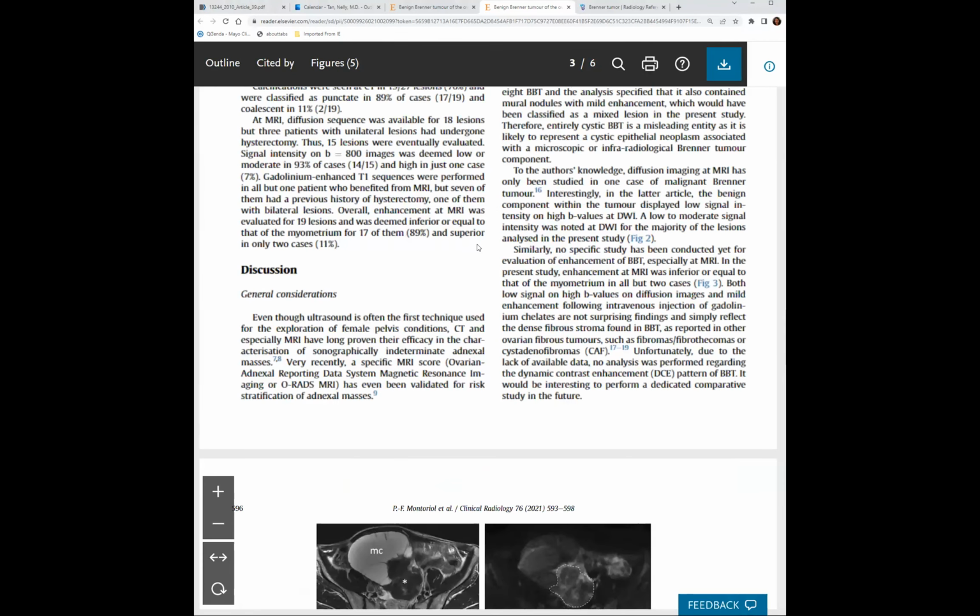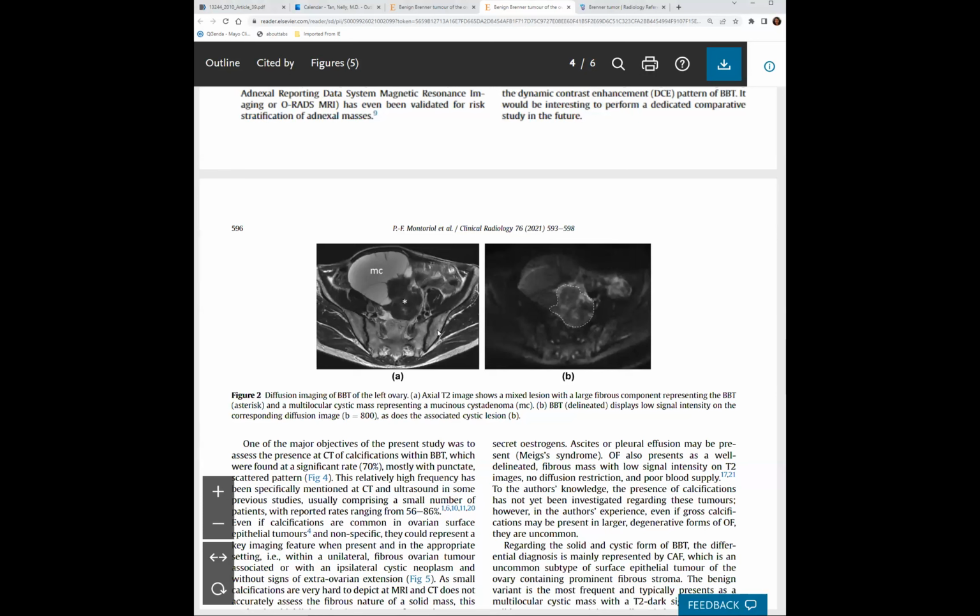Now I'm Googling about O-RADS, because I know that one of the things is if it's dark, that's O-RADS 2 for all of these kind of fibrous lesions. But I will try to look that up later. But I guess your point makes sense, that if it's more intermediate and much more solid looking, don't put it in the benign fibroma, fibrothecoma spectrum, right? Exactly. Okay. Thanks.